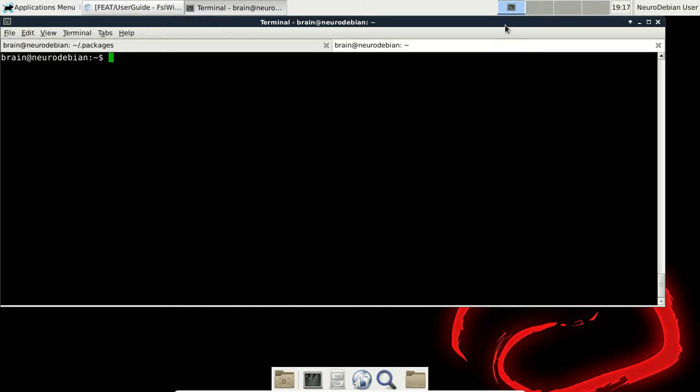This one was a little bit confusing, so I'll give my best explanation on how to complete all the steps. That said, I'm not an expert using the FSL GUI either, so this might be interesting to see us walk through this together. First step, as always, is to cd into the UIowa lab course directory, labs.jdcat, and we will open up Jupyter here.